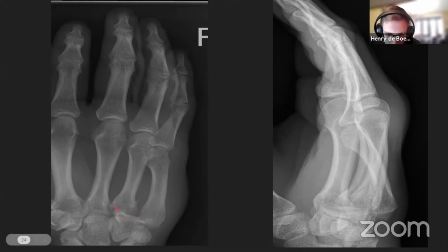And the alignment between the base of the little finger metacarpal and the hamate just doesn't look right. There should be this nice uniform joint space, but it's not. It's overlapping here. So this doesn't look right, and there are some fracture fragments. Exactly where they've come from, perhaps difficult to say. Is the cortex here abnormal? I think it probably is.